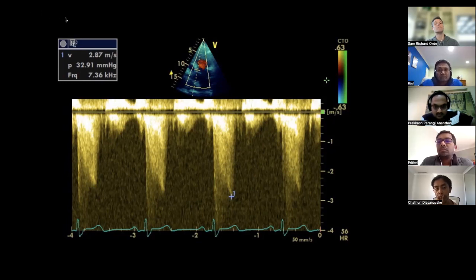In this case, I would think more of LVOT obstruction, given that the 2D valve didn't look grossly wrong, and there was some flow acceleration. What else could the two peaks be? So it could be LVOT or aortic stenosis. Could it be anything else?